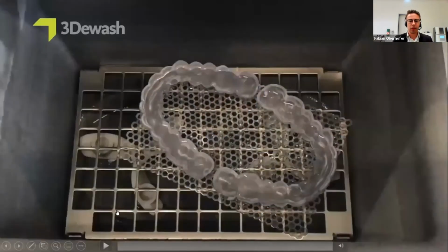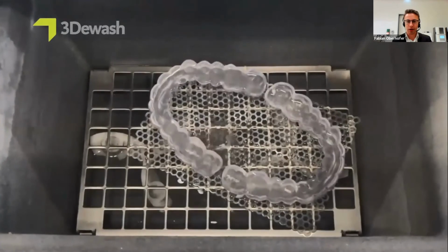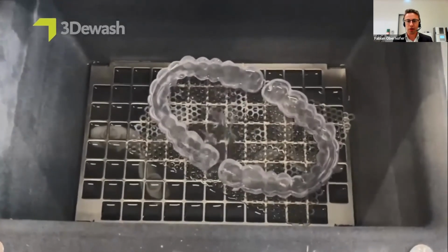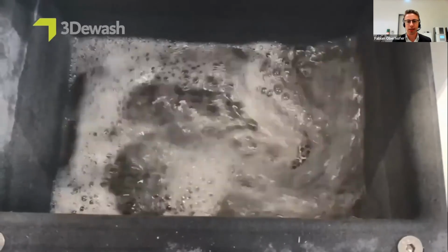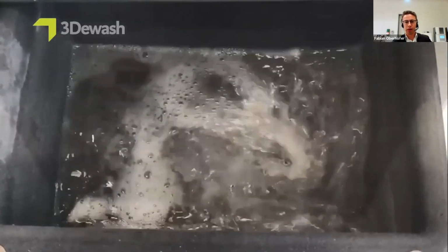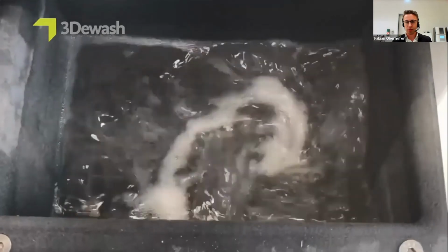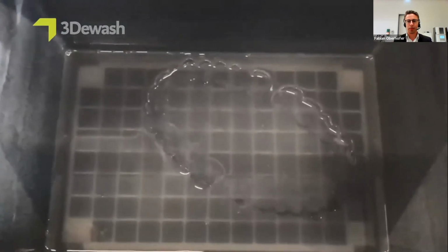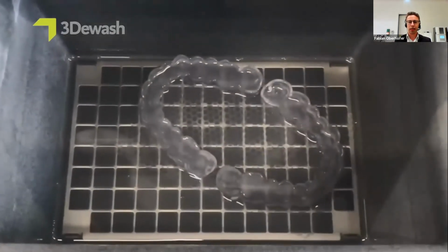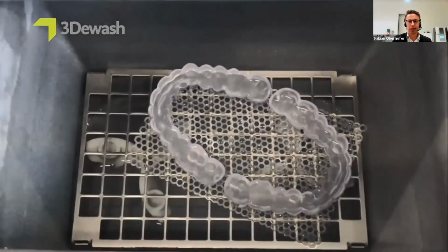As promised, this is a video of how it looks inside the 3D wash. The material gets flooded into the container, and this is isopropanol for cleaning. This is the best material for cleaning 3D printed objects. Now the 2 propellers start to swirl the material around, so the splint is cleaned perfectly from all sides. When this process is done, the isopropanol and the remaining liquid printing material get pumped away, and the drying process starts. So we have a perfectly cleaned and dried object, or 2 objects in this case, 2 splints. So this is how it looks inside of the 3D wash.